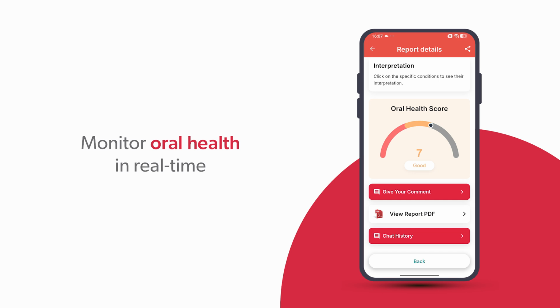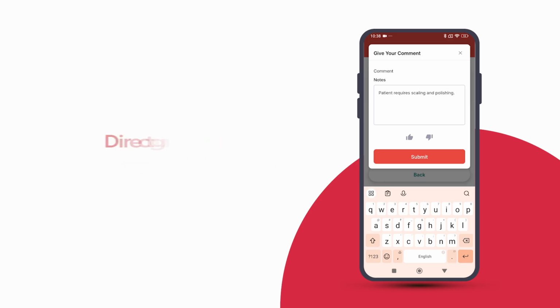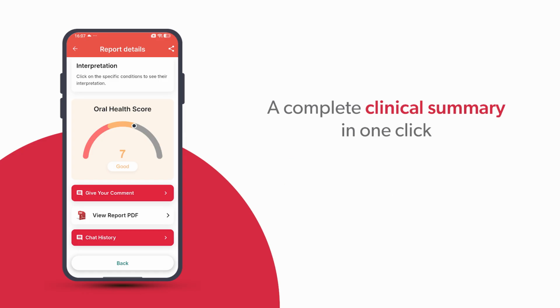While the health meter tracks overall progress, the dentist adds personalized feedback directly to the report for the patient to review. For a full record, the PDF report provides detailed results.